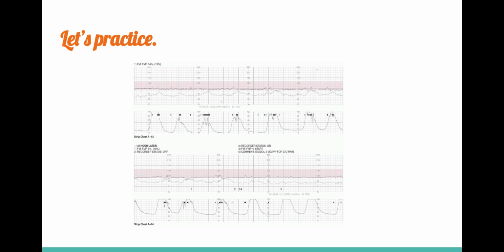Let's look at the duration. We have 1, 2, 3, 4, 5, 6, 7 blocks. We're going to say that one's 70 seconds. Let's look for the shortest one. Let's not count every single one. 1, 2, 3, 4, 5, 6, 7. Yeah, they're about 70 seconds long. And down here we have some that 1, 2, 3, 4, 5, 6, 7. Yeah, about 70 seconds pretty consistently.